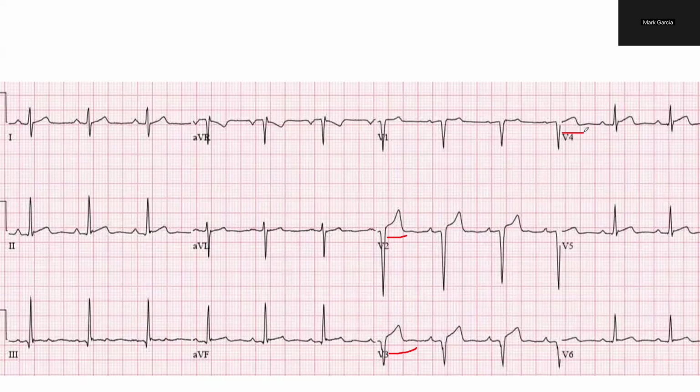And you think, okay, well, it's a young person. It kind of looks like it might be a smiley face. It's concave up. That surely makes me happy.